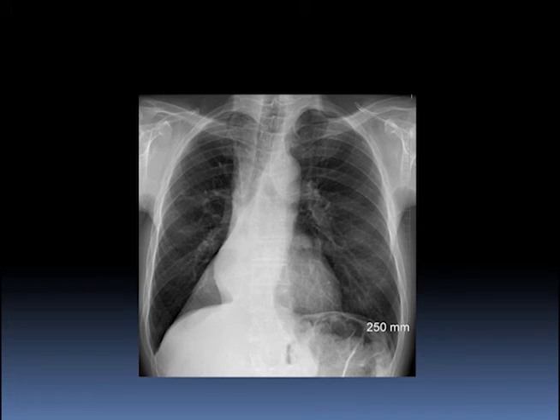Now, sometimes we get collapse of the right lower lobe as well. We can get collapse of any area. But this is an example of a right lower lobe collapse. I think you can tell there's volume loss. Okay, the bronchus is pulled way down, and it stops right in the middle of an area of consolidation, which is that triangular shape. That straight line is caused by a fissure which has moved in, and that's the major fissure.